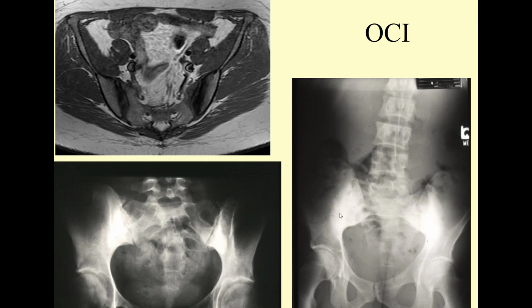And if you get even a little good with your ABCs and do take that look inside of every bone, you couldn't help but notice how big this area is, how dense this tissue is. Now remember, on an MR image, you can find bone, go to the outer layer, see how dense it is here. So this has to be an MR image. And look at this signal void, again, on the iliac side of the SI joint. Again, dense bone of any kind, when taken to MRI, will result in a reduced signal intensity.